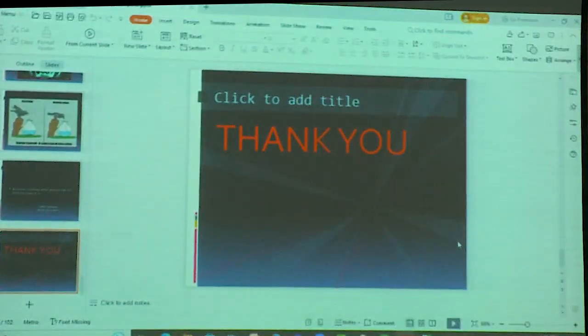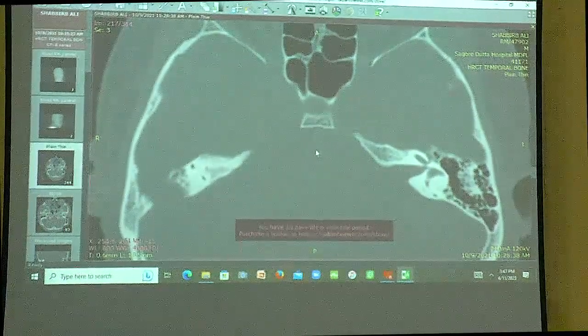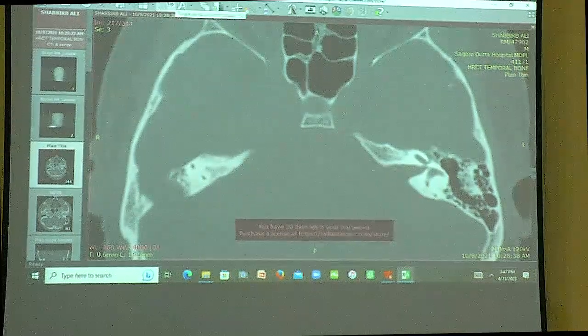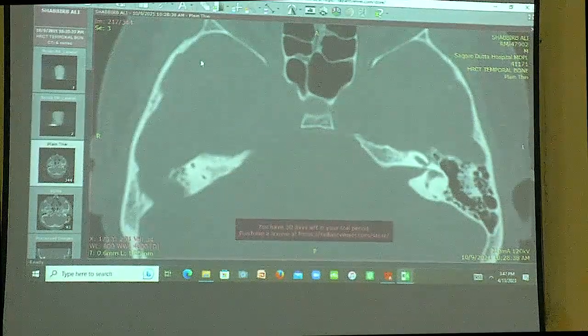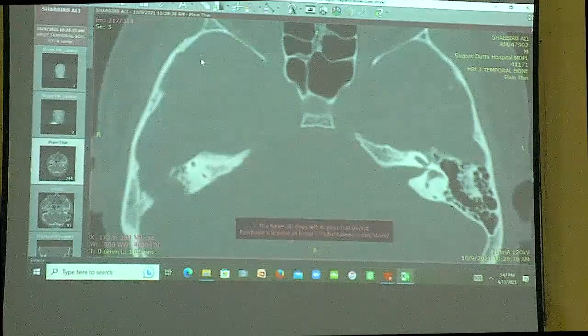Thank you. Download this software, it is free. It is known as Radiant Dicom Viewer. Okay. This is written up here, Radiant Viewer. The only problem is the trial license is for 30 days. So you can change it every 30 days, but it will give you a wonderful view. You can do anything with the CT scan.